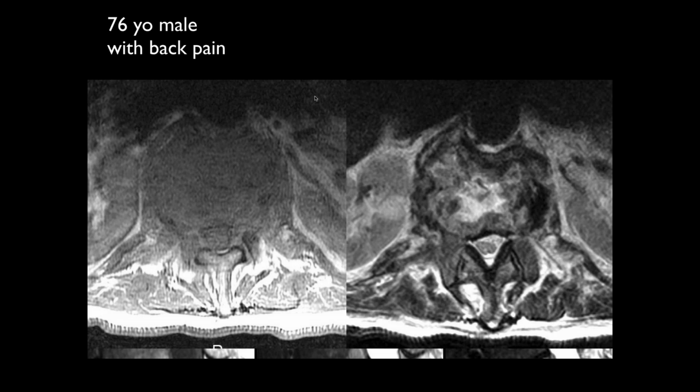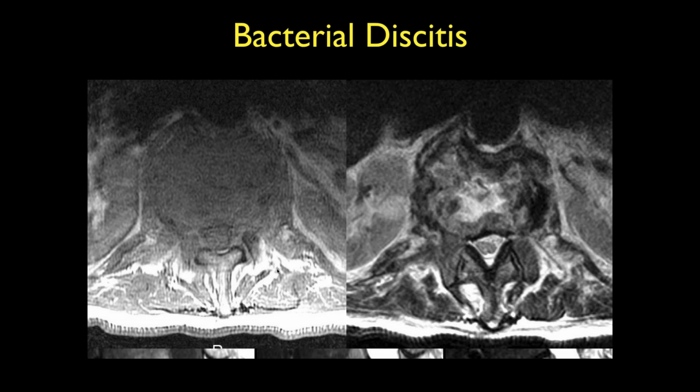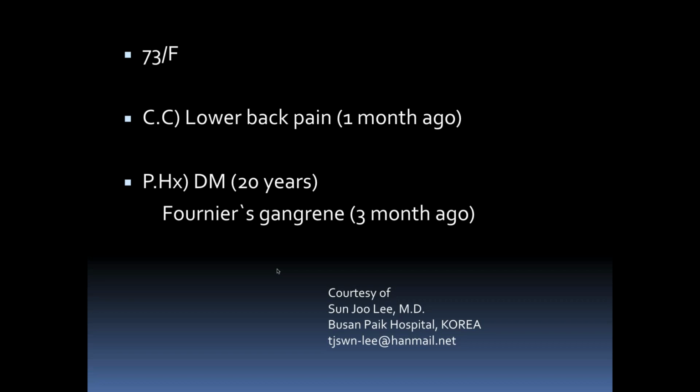Okay, and I'm not sure if that's really in the right psoas. Okay, so we have an epidural collection. There's some, I think, impression on the. So this is just another bacterial discitis. Okay, so pretty typical appearance.